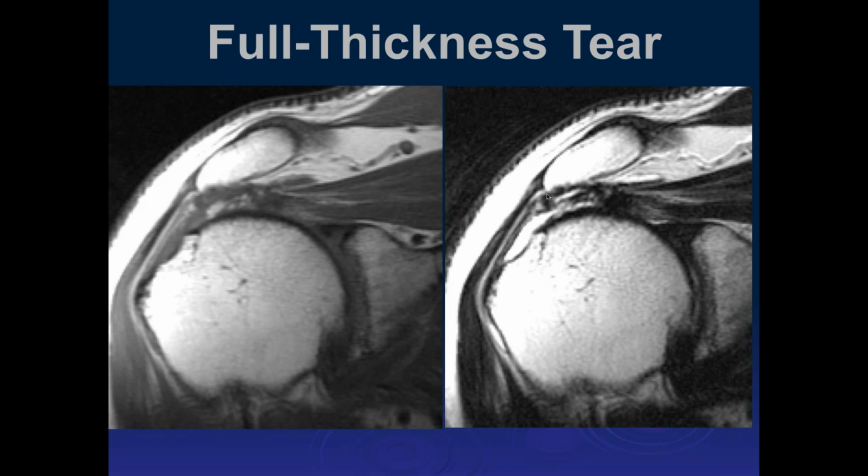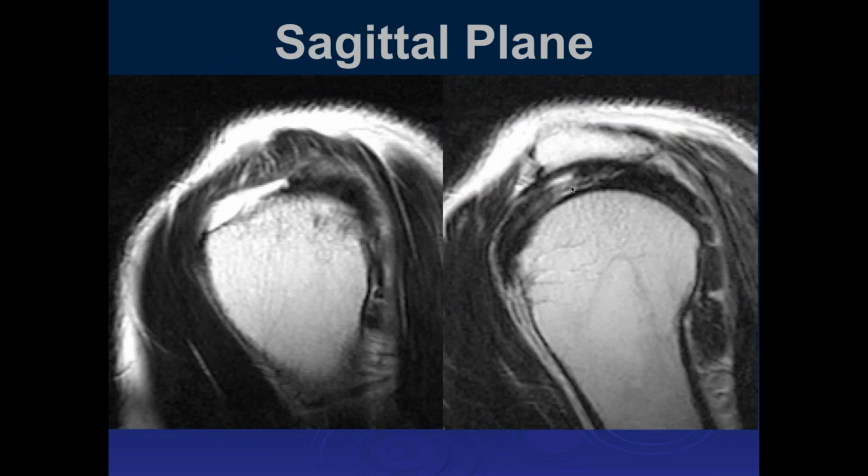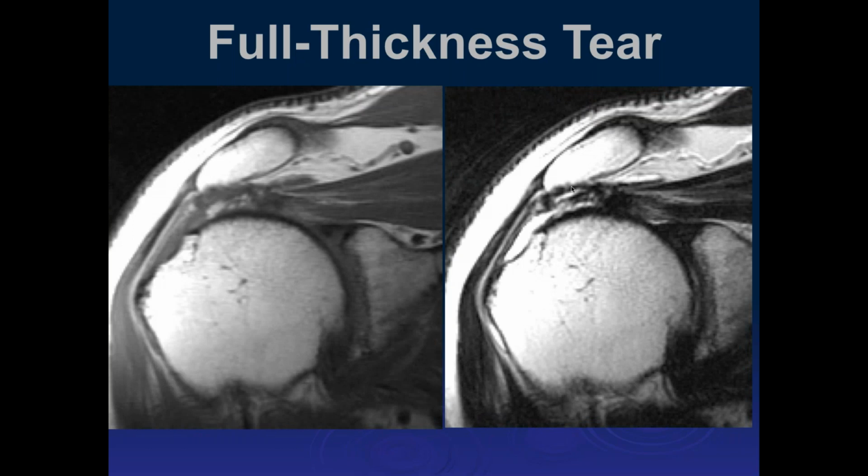And here we can also start seeing some rotator cuff arthropathy. We're starting to see degenerative disease of the inferior surface of the acromion process. Would that concern you as far as stability is concerned? That last slide. All right, here, as far as you mean stability of the humerus? Joint, glenohumeral joint.